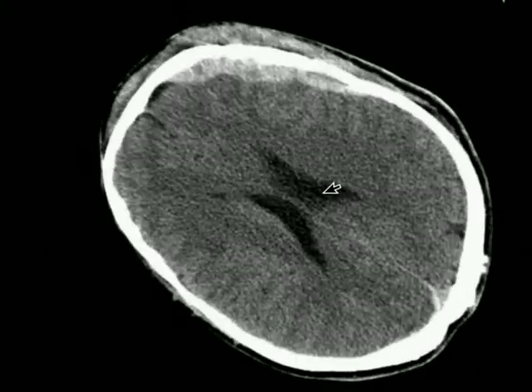Just wanted to mention that this is actually a CT scan of a relatively young patient. Elderly patients, especially patients with dementia, tend to have a bit more of a CSF-filled gap in between the brain and the skull. And this gap means that they can often tolerate smaller intracranial bleeds quite well.